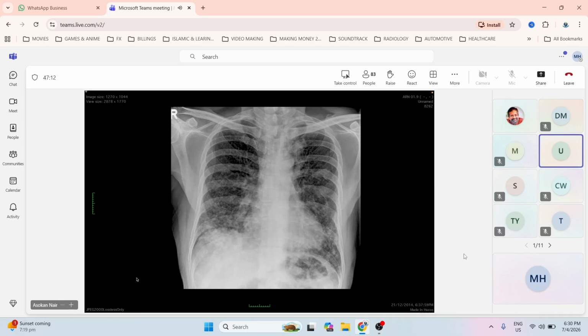Isaac from UIA. I'm given a frontal chest radiograph in a skeletally mature patient. From this chest radiograph, I can see multiple reticular opacities involving both lung fields, and there are several lung nodules with the largest seen at the bilateral lower zones as well. Apart from that, I don't see any consolidation or cavitating lesion. There is no pleural effusion noted bilaterally, and there is no pneumothorax.